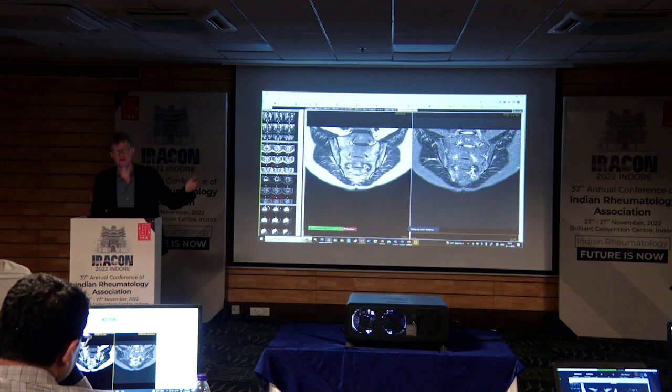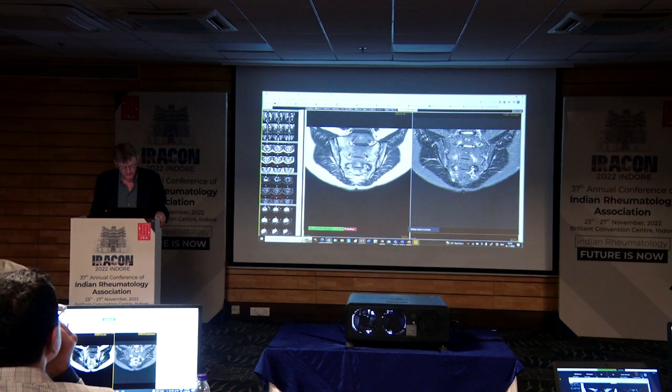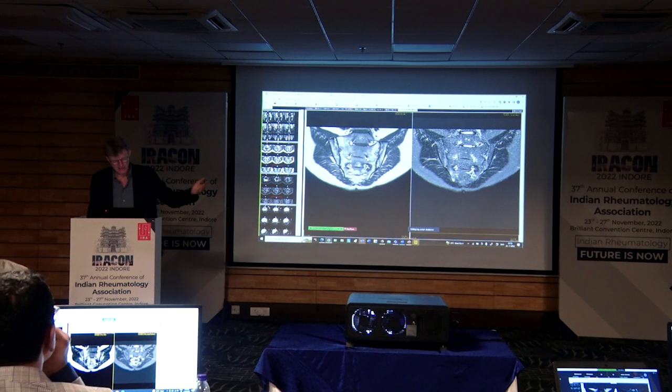And there's plenty of other erosions to look at, but always take care in this transitional area between ligamentous and cartilaginous. What you on the other hand see here is backfill. And many of you also said that there was backfill at different locations. If you follow the definition, which is having a black line like here, that's separated from the normal bone, and then some bright tissue, fatty-like, looking different than normal bone on the outside, then this definitely fulfills the criteria, and that is backfill.